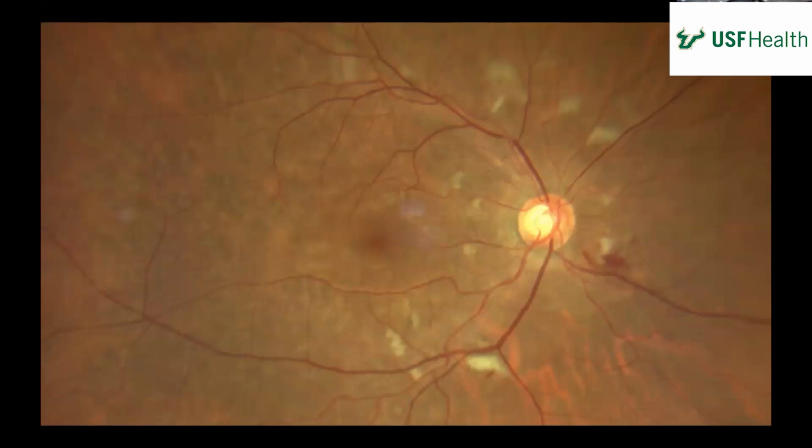Does anybody remember why they form here? The radial peripapillary capillary network. There's a radial peripapillary capillary network, which has fewer anastomoses than the other capillary networks, and so they tend to form at the end of that network. So if you see cotton wool spots and you're not here, then you have to be a little nervous. Like if you have a cotton wool spot there, that's not right, or over here. But these are just typical radial peripapillary capillary network cotton wool spots. All right.